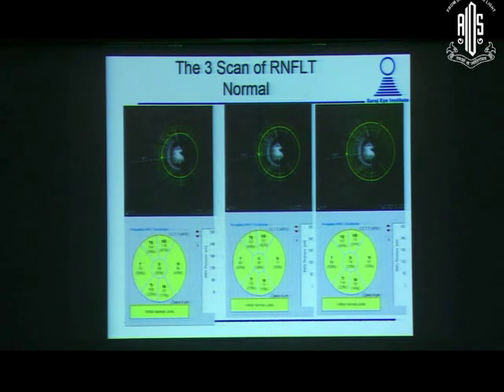And now, of course, there are 3 scans of the retinal nerve fiber layer that you can get. So you have an inner circle, a middle circle, and an outer circle. And this can to some extent take care of the problems that you get, especially when you have large areas of parapapillary atrophy. I still do not know the exact clinical significance and how it's actually going to help out, but we hope that by doing the outer circle, perhaps we may be alerted to early retinal nerve fiber layer loss, though it's too premature to say anything like that.